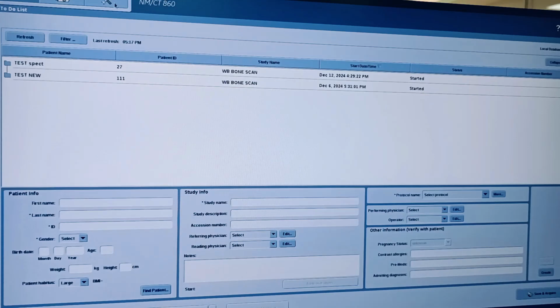So we are going to create a protocol for actinium acquisition. Actinium-225 is a dual energy emitter. One energy is 218 keV and the second is 440 keV, which is suitable to scan using a high energy general purpose collimator.